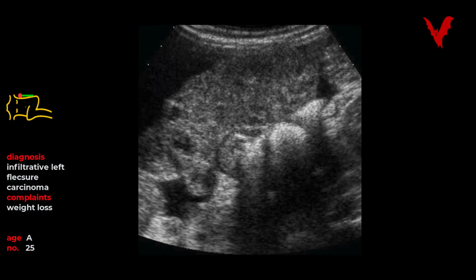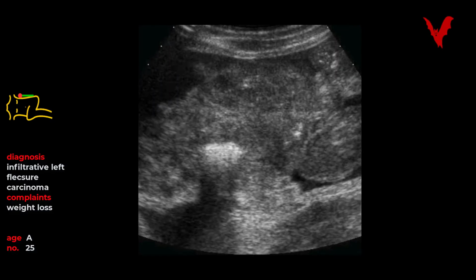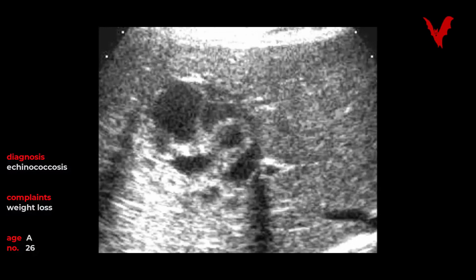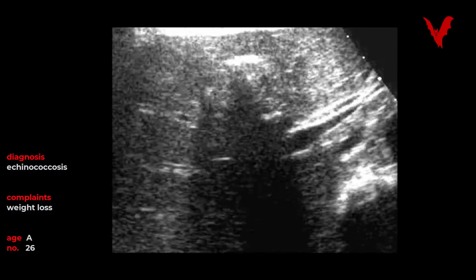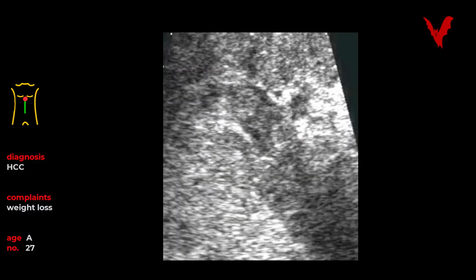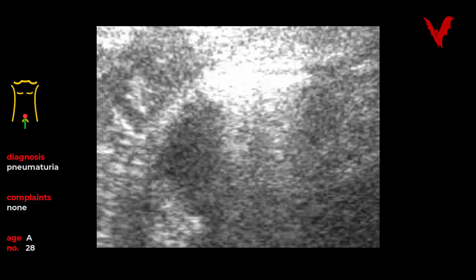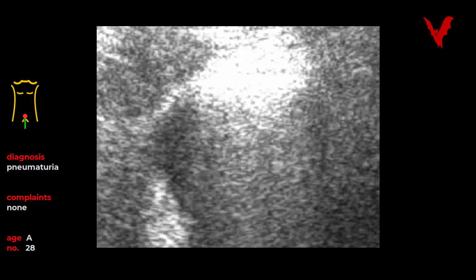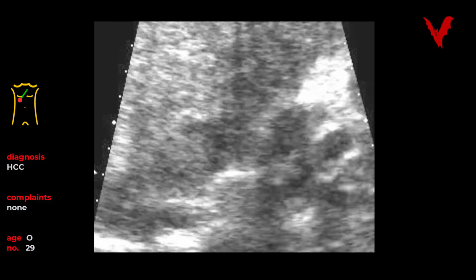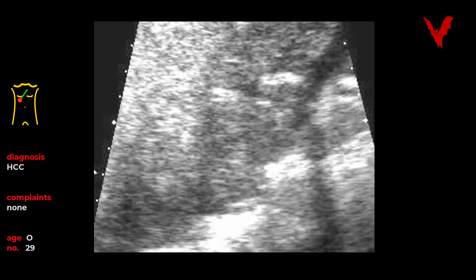This carcinoma in figure 25 showed already splenic infiltration, whilst here in figure 26 both a vital and a non-vital echinococcosis are shown. CF technology reveals in figure 27 a typical tumor thrombosis. In this case, figure 28, inflammation had led to a urinary bladder leakage.